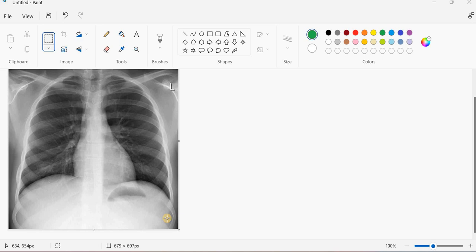First of all, to identify the location of the heart apex: is it in the normal location, which is the fifth left intercostal space, yes or no, or is it sometimes shifted down below? This is one. The second thing: through counting the ribs, we can on each side determine or draw the extent of the lung lobes, and based on that we can determine in which lobe of the lung the pathology is located.